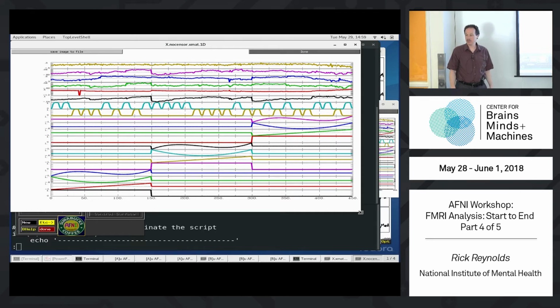I see a first, second, and third order polynomial there, like the black, red, green, blue. You have all 3 of them. When you had polort 3, that includes 1 through 3, not just 3. All of them. To model any cubic polynomial, you need the lower order terms too. So this will fit any cubic trend. It doesn't have to look like this. Anything that has a cubic trend will be comprised of these 4 terms.